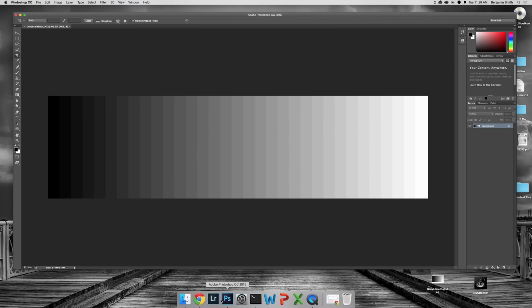The best way for me to demonstrate this technique is to fire up Photoshop and show you how Photoshop interacts with color. So here I've got just a grayscale image. It's a gradation between totally black over here on the left side of the screen and then totally white on the right side of the screen. This is 33 different grayscales broken up. And so every ultrasound image is essentially just like this. It's a moving set of stills that are gradations between white and black. So this will be a good demonstration.